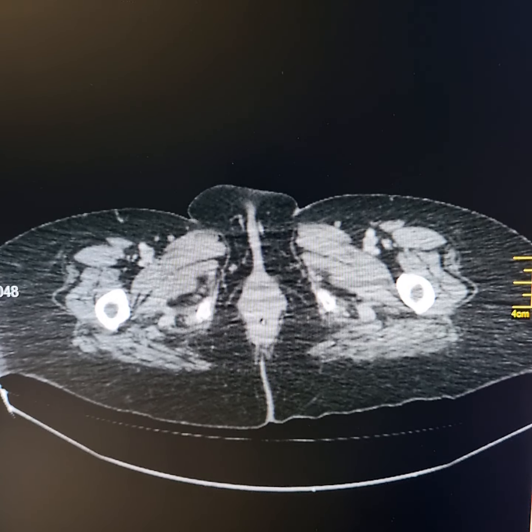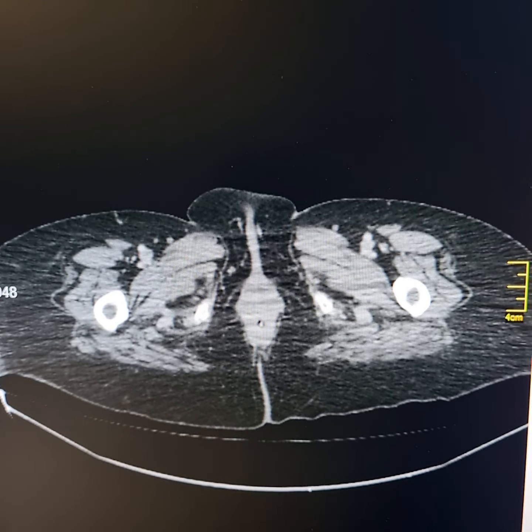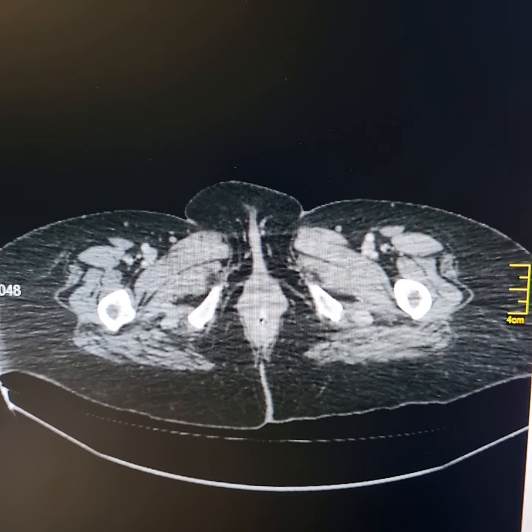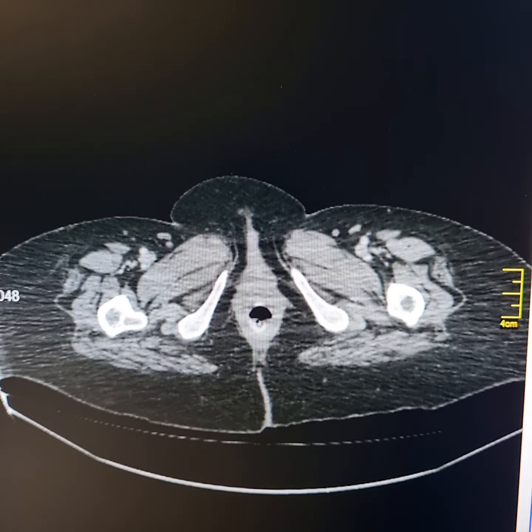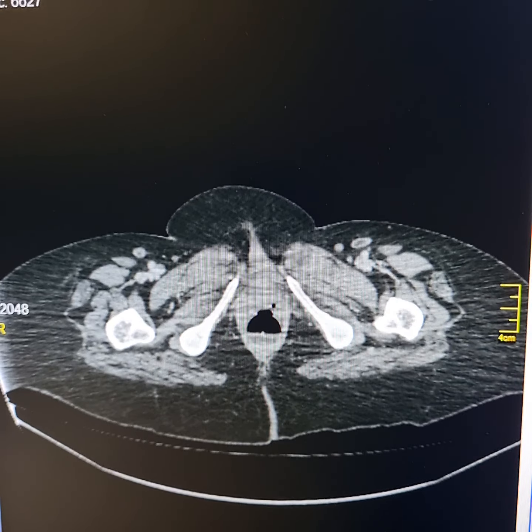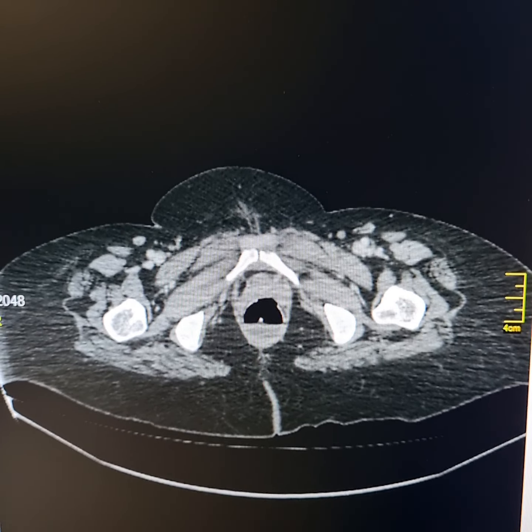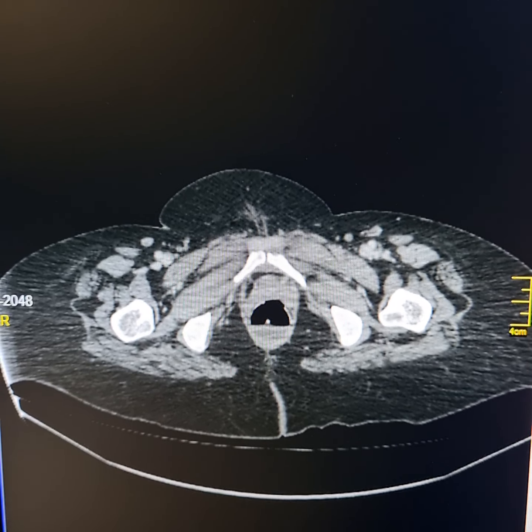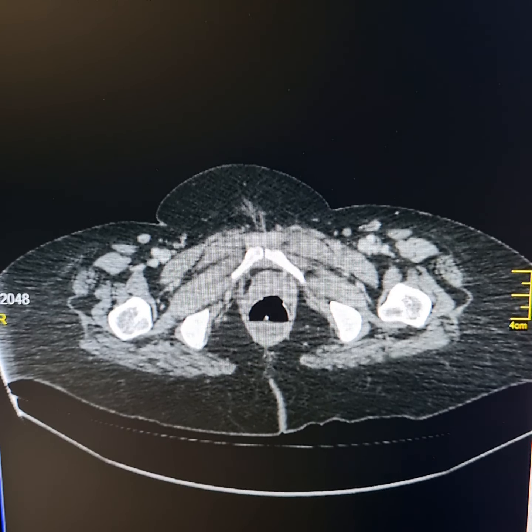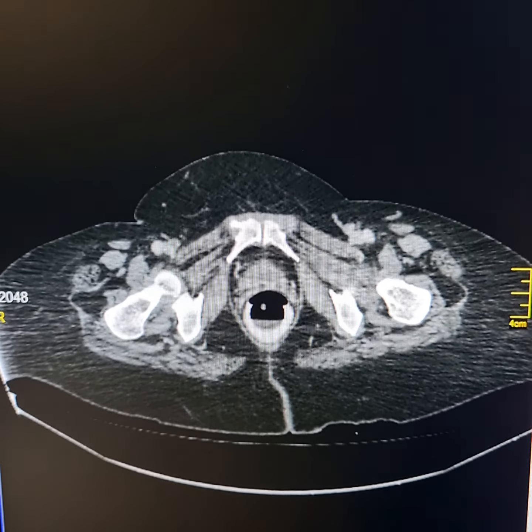This is a contrast CT scan of abdomen and pelvis of a 57 years old female patient. The patient was diagnosed to have left renal multiple calculi and pyelonephritis. Left nephrectomy was done. About 7 days later, the patient started having initially pus discharge and then still later the feculent material from the site of incision.